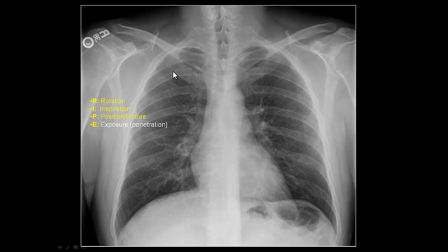And also in an AP view, it's very helpful to know if the patient is supine, upright, or angled. So we can look at these beads in the marker that show us based on gravity where they fall. So these beads are falling lower down at the bottom of the circle, so this patient is upright.